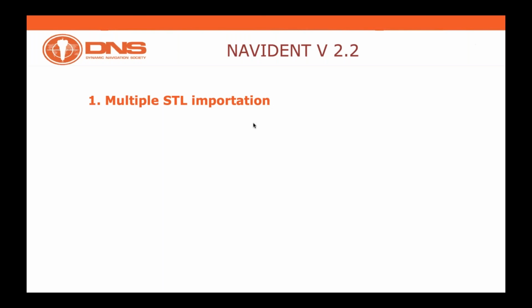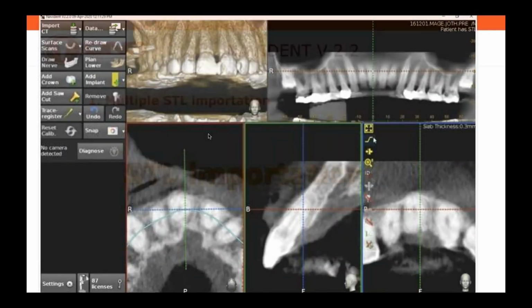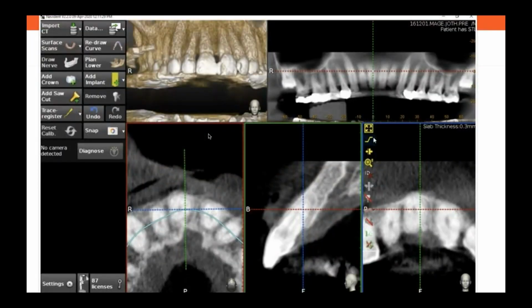So that is a thing that we are talking about in the next few minutes, and I'll explain how the whole thing will take place. First of all, this is a quite familiar picture for those who know and use Navident. I will explain briefly for those who are newcomers to Navident.